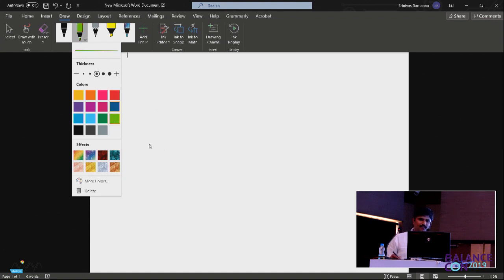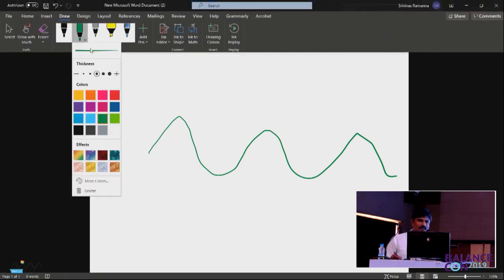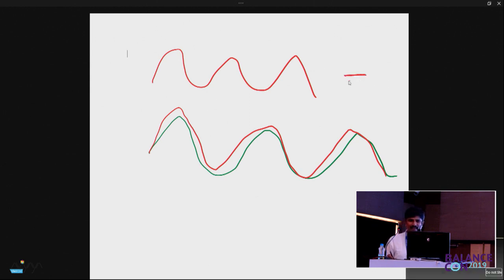the target, how does the target move? Target moves in a sinusoidal fashion. Okay. Target moves in a sinusoidal fashion, and a normal eye also will move along the target in the sinusoidal fashion. Is that right? Please pardon the not overlapping lines. So the eye also moves like this. Target also moved, exactly. Both of them overlap, which means the velocity of the target and the velocity of the eye were the same. They were equal.